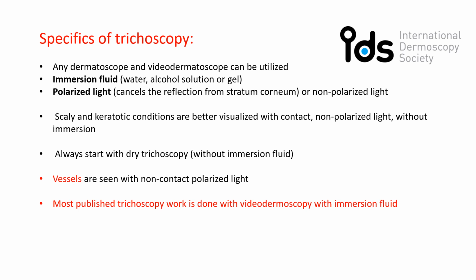Vessels are better seen with non-contact polarized light because the polarized light cancels the reflections from the stratum corneum, and you can see the dermal processes better. Most published trichoscopy work comes from video dermoscopy with immersion fluid.